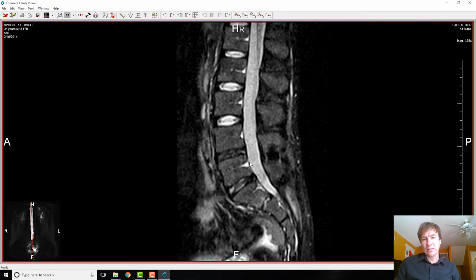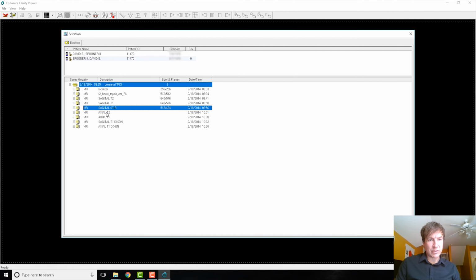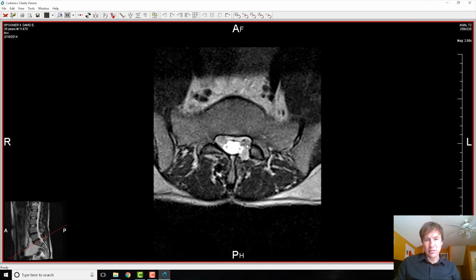So this surgery in 2014 that we're looking at right now, he only worked on the lowest L5S1 disc.